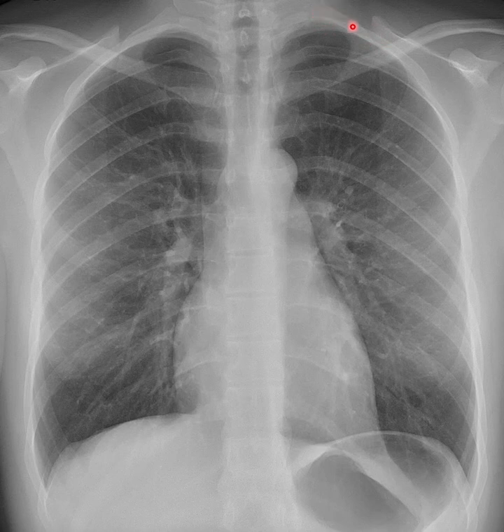Let's check this out. First rib, then we can find the second rib here, third, fourth rib here, fifth, sixth, 7, 8, 9, 10, 11 posterior ribs seen above the diaphragm on the left side. So we can tell by that, by counting out those ribs, that they got a nice big inhalation and we're able to expand the lungs for us. So that is how we can identify that we have all of the anatomy included on the image that we need, and then it's a diagnostic image for the radiologist to read.